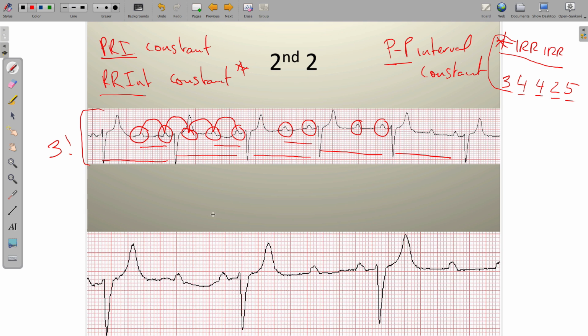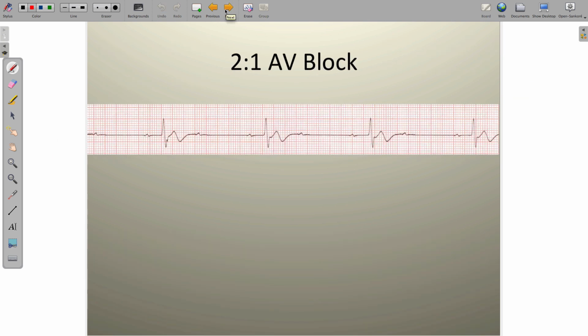All right, so same thing here. This was just a blown up version, a zoomed in version, just to say that if you want to measure out your P waves, you'll see that P wave activity actually falls right inside the T wave. So there's actually a little P that's in here. It looks just like this if we could isolate it, but in fact repolarization of the ventricles has taken place at exactly the same time, and therefore we end up with a T wave that completely masks the atrial depolarization activity.